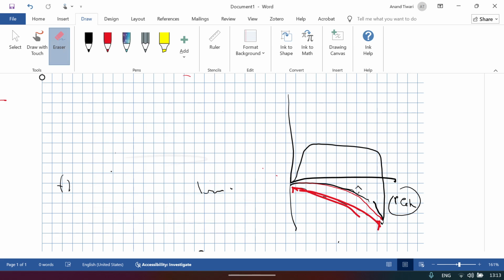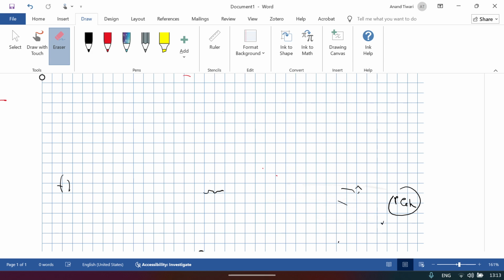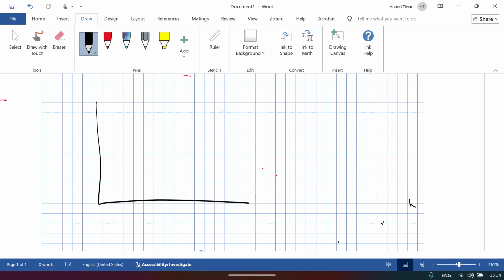Suppose you get an expiratory limb which doesn't touch the original baseline. This is the flow, this is the volume, and during expiration it is not going back to where it started. This will signify a leak.